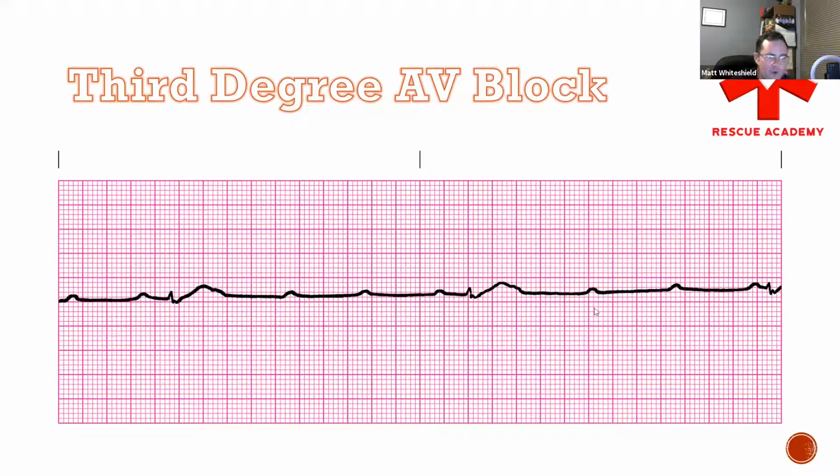It's not dropping, because there's only one QRS complex, right? Look, if all of these were the exact identical PRIs, this would be a second degree type 2. Sure, it would be a 3-to-1, second degree type 2. But because of this QRS complex here at the end, the one at the end is what changed it all. That PRI here at the end is different than these others. That's what makes it irregular. All right, that was a hard one though. I'll give you that.